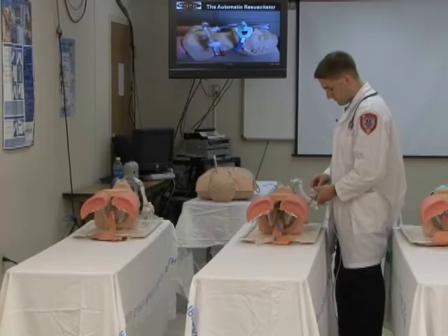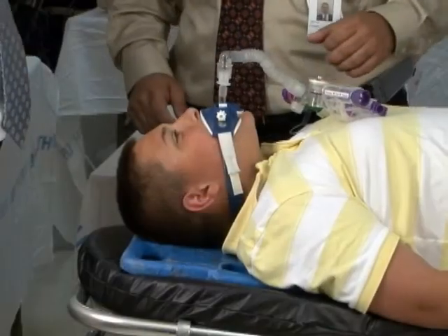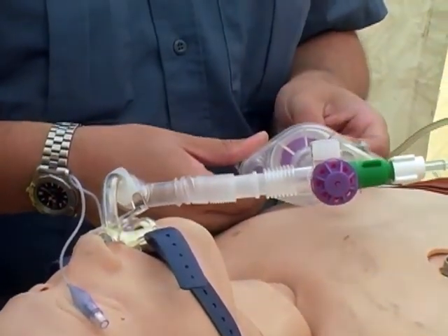The automatic gas-powered resuscitator is a safe, effective, and reliable means of short-term ventilatory support. We hope this video has provided you with a clear understanding of its safe and effective operation.